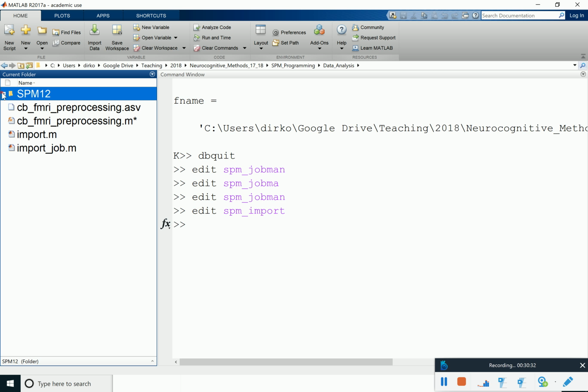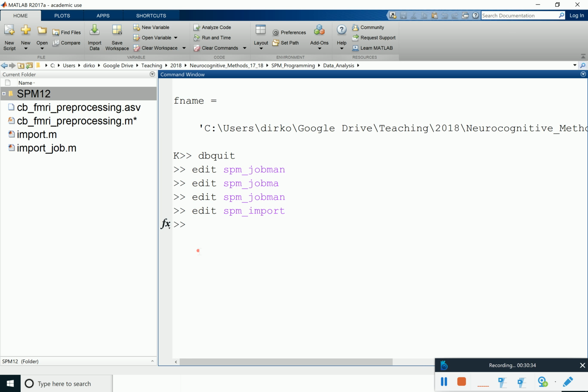Image header, this is what you also see a lot, is the same thing as the par rec. There you have a header and the actual image, and then you have many volumes, or do you have one volume? Many volumes, yeah. There's still this dream about not having many volumes, but having a 4D file. But I think this dream has not really come true under SPM 12.